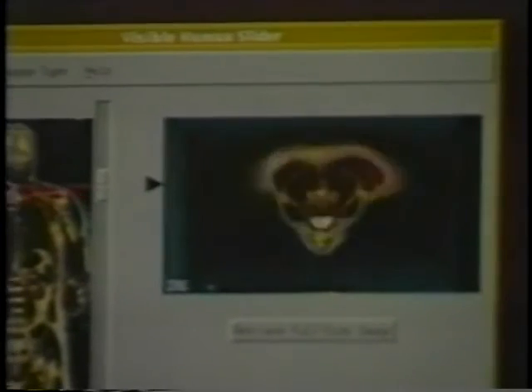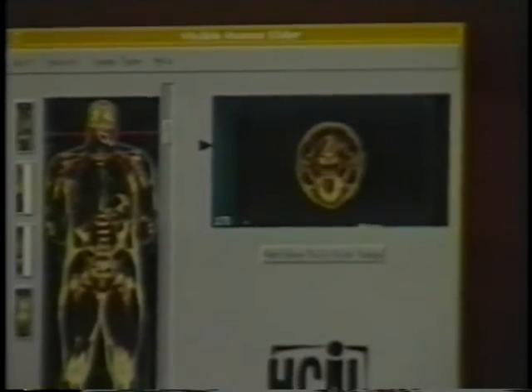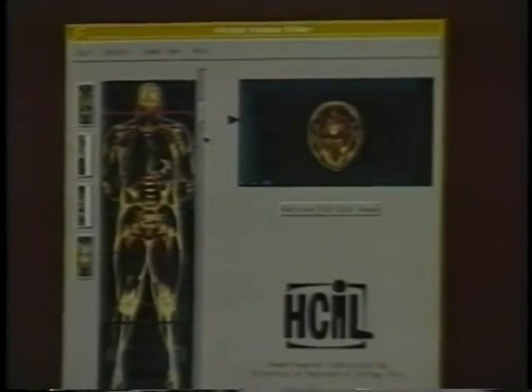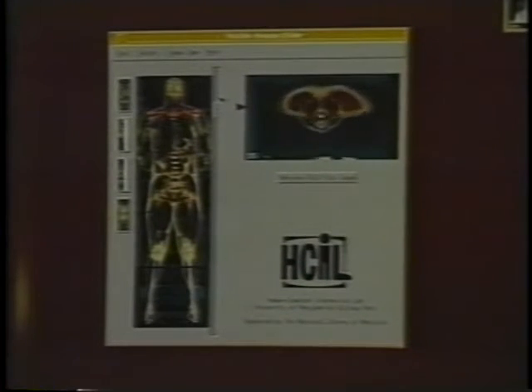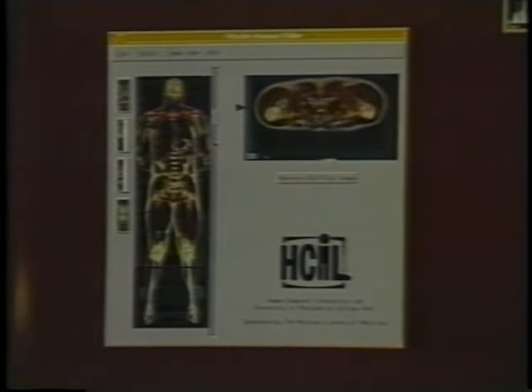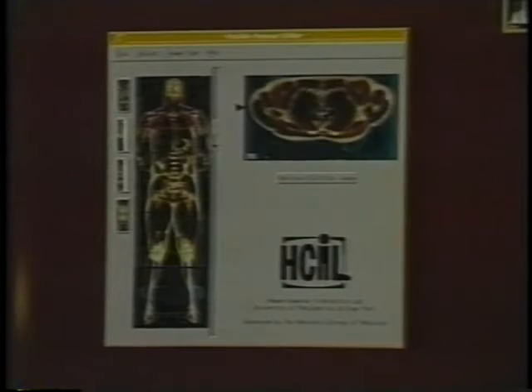In summary, this interface allows us to explore volumetric data using a 2D view with slider control through the 3rd dimension. We browse with rapid, incremental, reversible actions while receiving immediate feedback. The overview helps to direct our search, promotes exploration without penalty, and provides context for the local view.